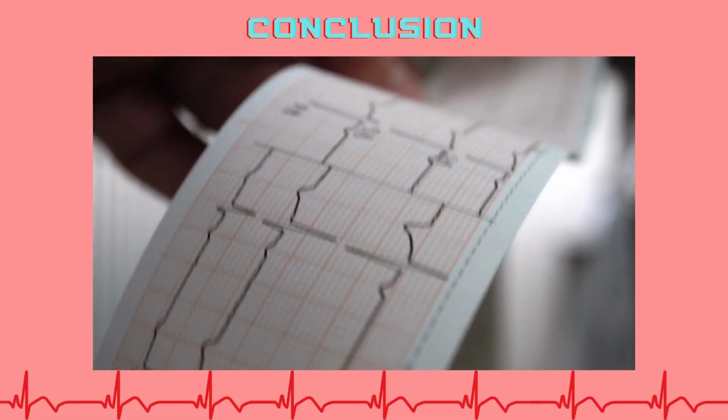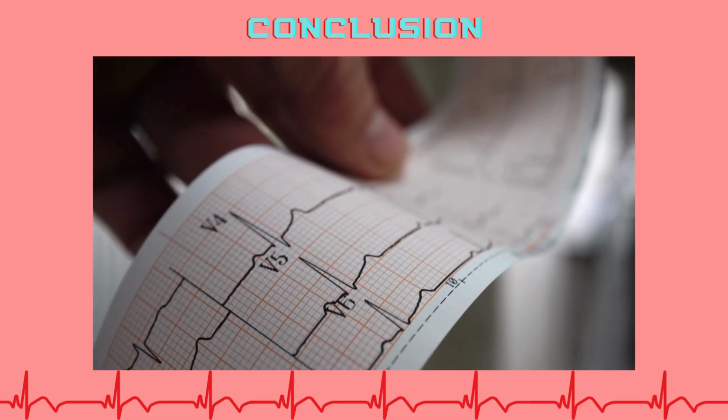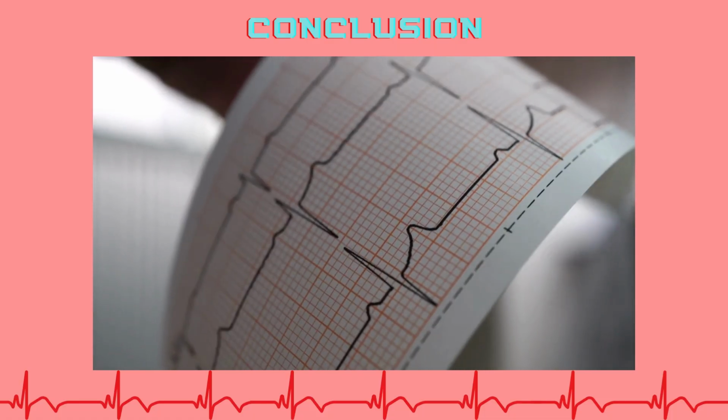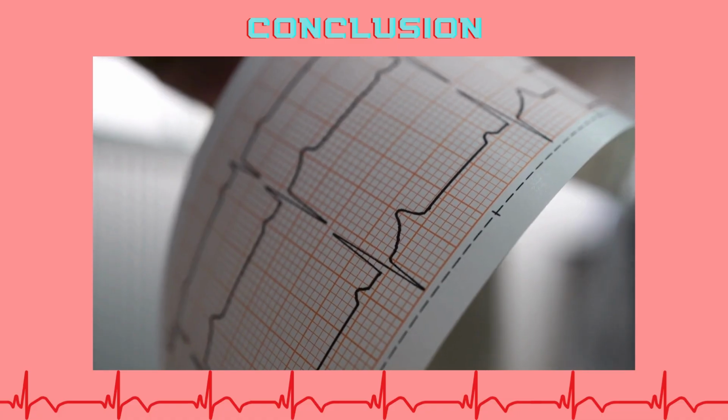The ECG grid and lead system are more than just lines and numbers. They are a window into the heart's electrical behavior. Mastering these basics provides the foundation for accurate and meaningful interpretation.